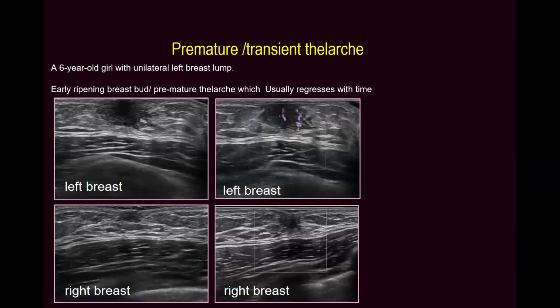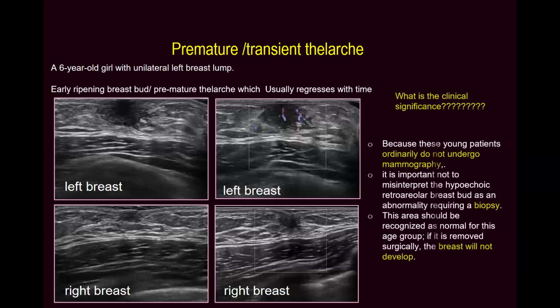It will regress after that. She's the girl presented with unilateral palpable abnormality. Unilateral. Yes, I have seen cases where they considered this as a mass and excised it, resulting in a mastectomy girl. No breast developed. Okay, so we have to be cautious.